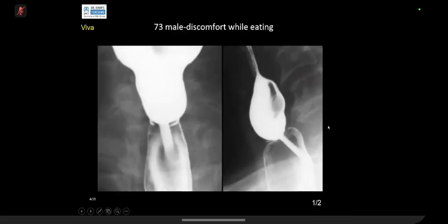Okay, exam case. Few of these are total exam cases, spot diagnosis. This is an exam favorite. Okay, Zenker's diverticulum, achalasia. You see, let me describe it for you. We are in the cervical region.